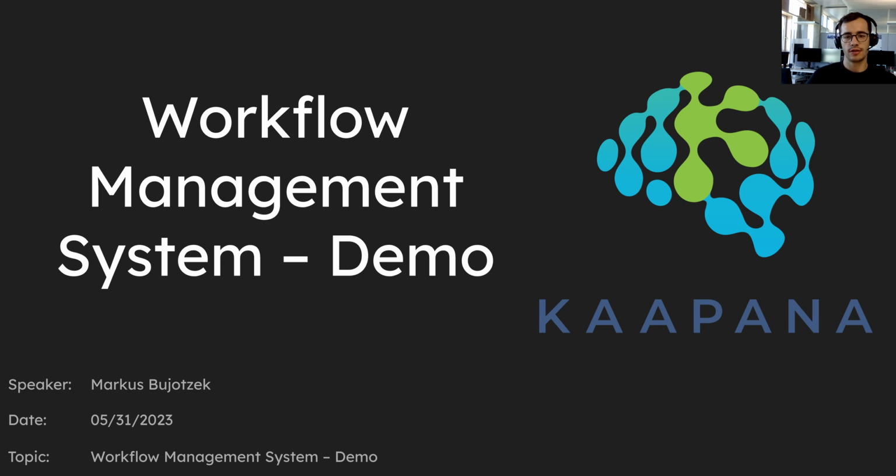I'm a PhD student in the Kaapana team and want to give you today a brief introduction into Kaapana's new workflow management system. In the latest version of Kaapana 0.2.0, the new workflow management system was introduced, and furthermore, the Kaapana object workflows. Workflows semantically bind together executed jobs on the platform, data on which the jobs are executed, and orchestrating and runner instances which execute the workflow jobs.